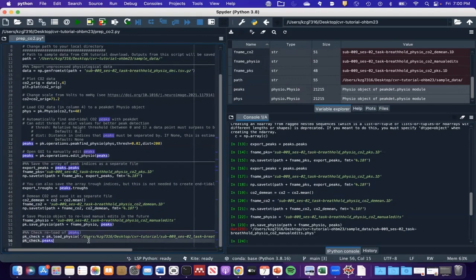So you could run this command directly from here if you want, but to make it easier for our purposes and also to show how you could script using this command, we will use a text editor to describe the inputs and then actually run that script from the terminal.